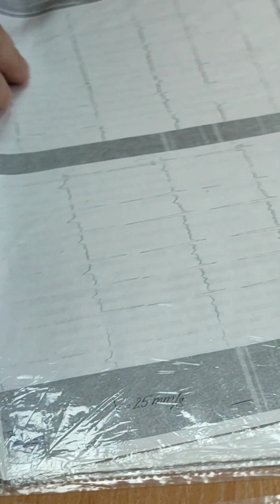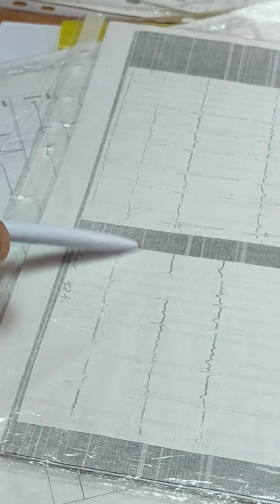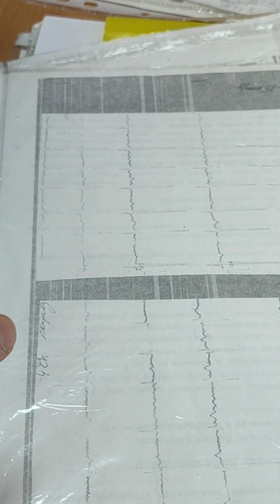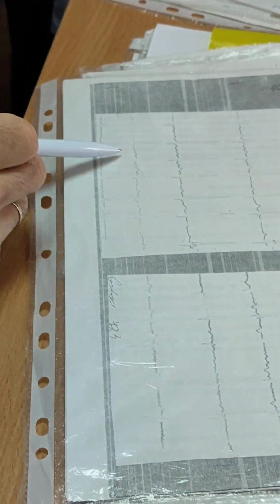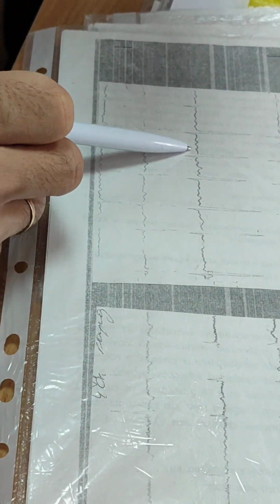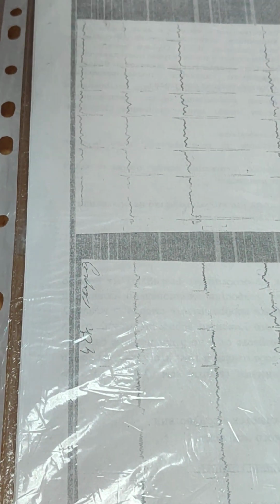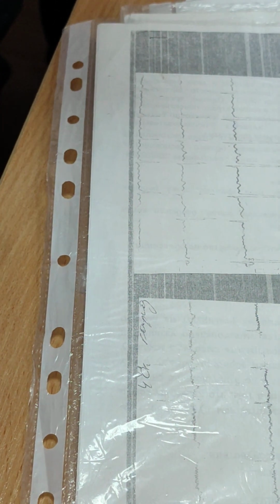This case, P waves are absent, rhythm is irregular. Non-sinus arrhythmia, what is the name of non-sinus arrhythmia? Atrial fibrillation. If you conclude flutter in this case, because there are some big waves in this place, it will not be a mistake. Atrial fibrillation and flutter are practically the same conditions, but everything depends on size of muscles which contract asynchronously.